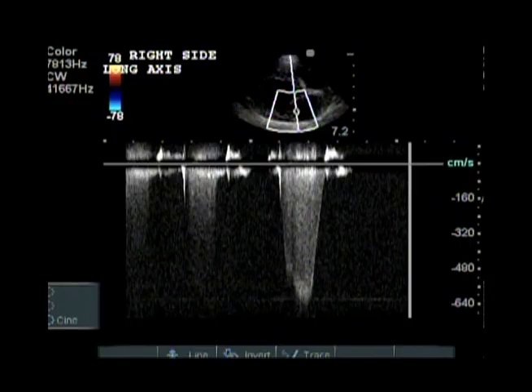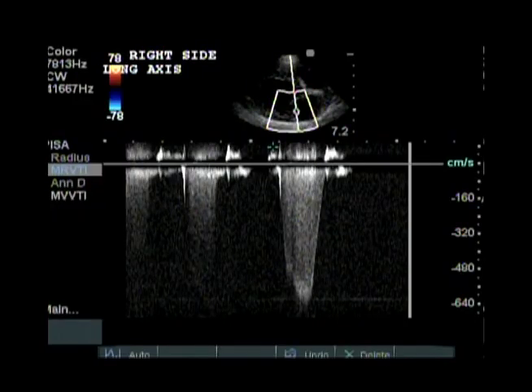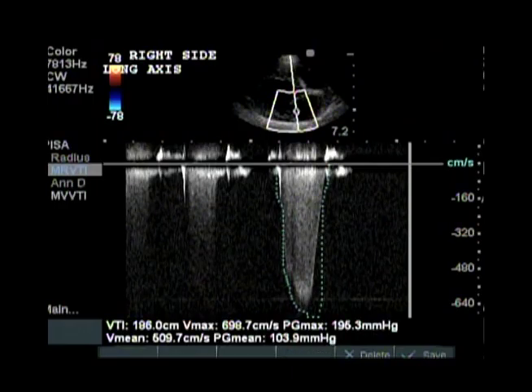This indicates that the left ventricle is generating a pressure of at least 195 millimeters of mercury and confirms the systemic hypertension. It also means that to maintain an aortic systolic pressure of 160 millimeters of mercury, the left ventricle must generate a pressure of 195 millimeters of mercury. The rest of the pressure is lost through the mitral insufficiency.